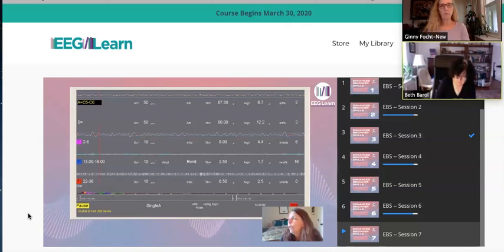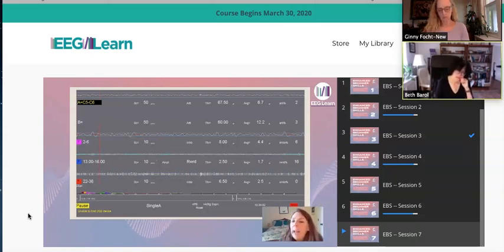So that's the reason why when you hit your F11 key, you'll notice it, and it stands out really strongly when you're doing bipolar training like C3 minus C4 or C5 minus C6. And when you get really small numbers, like I've seen and you will too, where all the average amplitudes are 3s and 2s, if you hit your F11 key, the lowest it will adjust any of your inhibit thresholds is 6 microvolts.